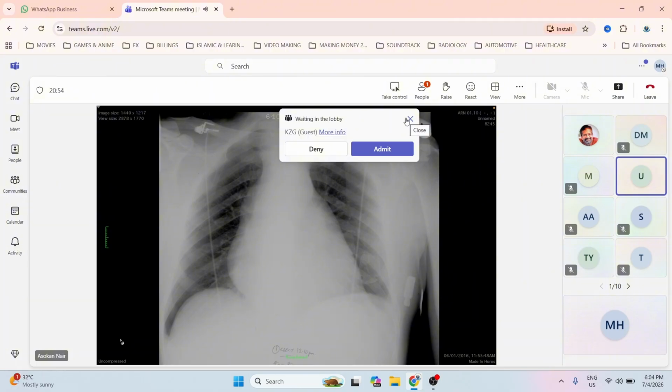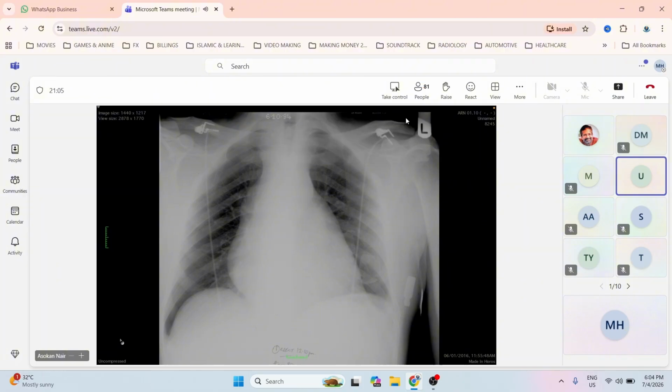This is a chest radiograph in an erect projection of an adult patient. There are lines overlying the bilateral hemithorax, giving the ECG leads. Here, bilateral lung fields are clear, no pleural effusion, no Kerley B lines. The trachea is centrally located.